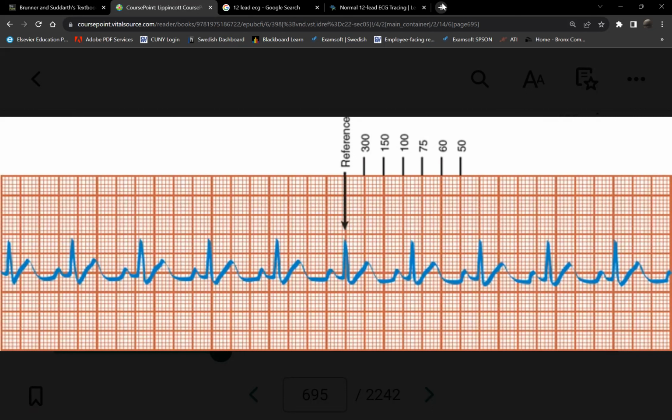Now you're going to be busy. So we're not using a 1 minute strip. We only use 6 seconds. So how do we know a strip is 6 seconds? Now on a real paper, you'll have 3-second markers. They'll appear on top. That's just an estimate, but let's mark our own 6-second strip.